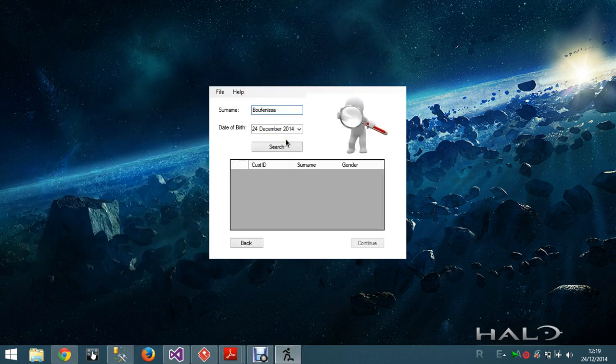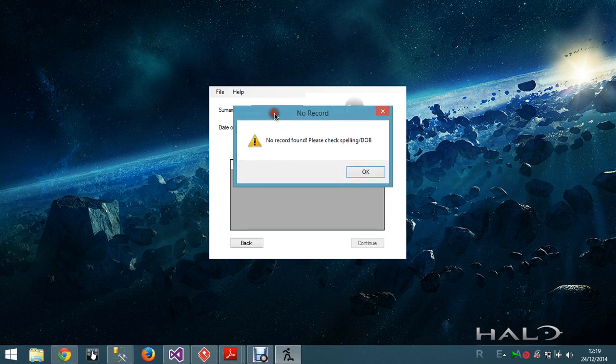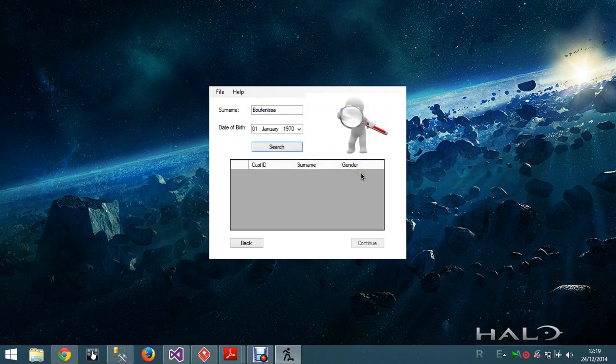Okay, so the record we just added was Bofinessa, his surname, and his date of birth was, I believe, 01 January 1970. Okay, let's click search. If the customer is not found, you'll get a prompt message telling you no record has been found, so you have to check the spelling or date of birth again and try again. I think I added 06. I'm not sure. Let's have a look. Yep, it was 06. As you can see, the query pulled up the record from the database.